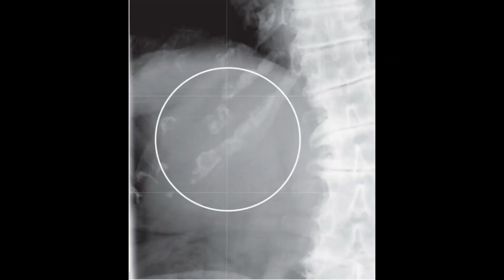In an older group of patients, some calcifications may appear in the images, such as calcifications of the cartilaginous parts of the ribs or phleboliths. These are considered to be normal, but of course if you see some calcifications inside of the kidney or in the wall of the aorta, you should think about the pathology.